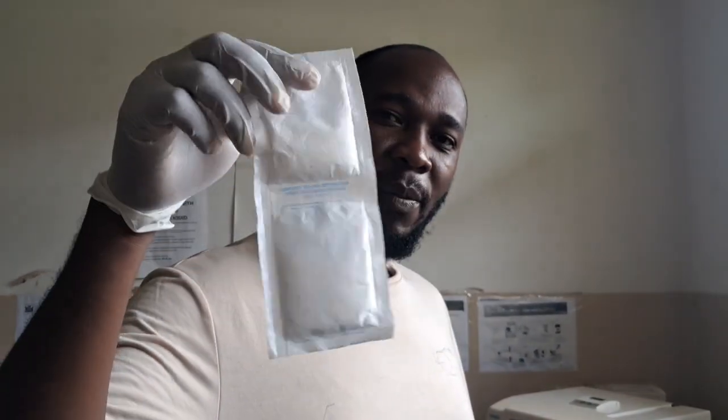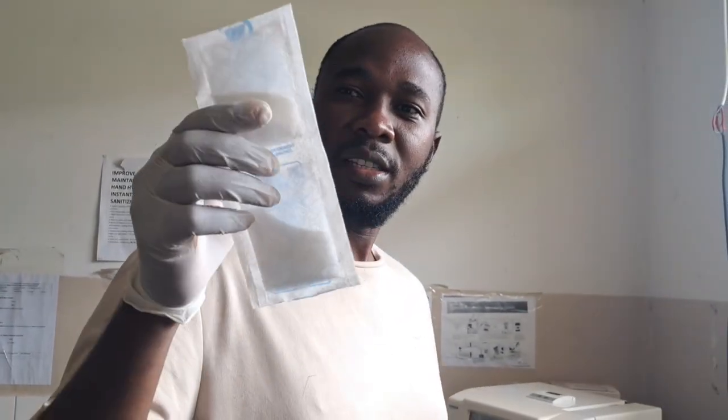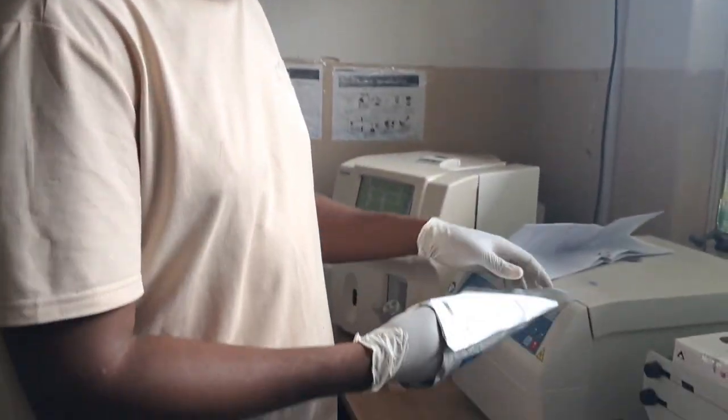So this one, if you want, you can stick it anywhere where you're doing the tests. You can stick it either in IPD, ART department, lab, OPD, anywhere you're doing the test. It will help you. It's a manual on how to do the test. Then inside, there's also this. This is a desiccant. The purpose of this is to make sure that there's no moisture in the test. Make sure you don't throw away those.